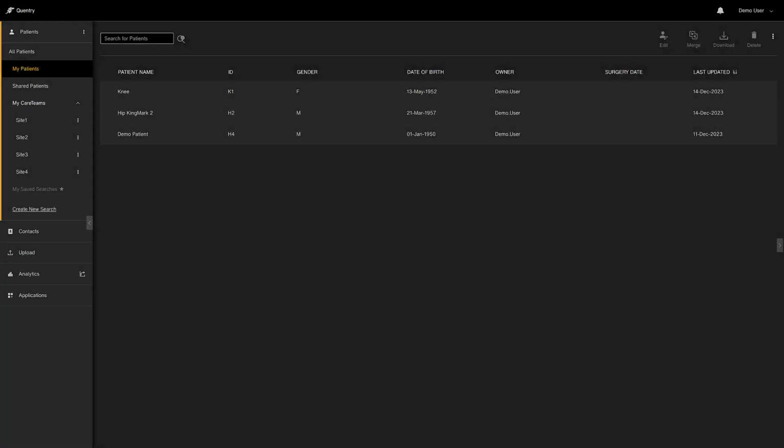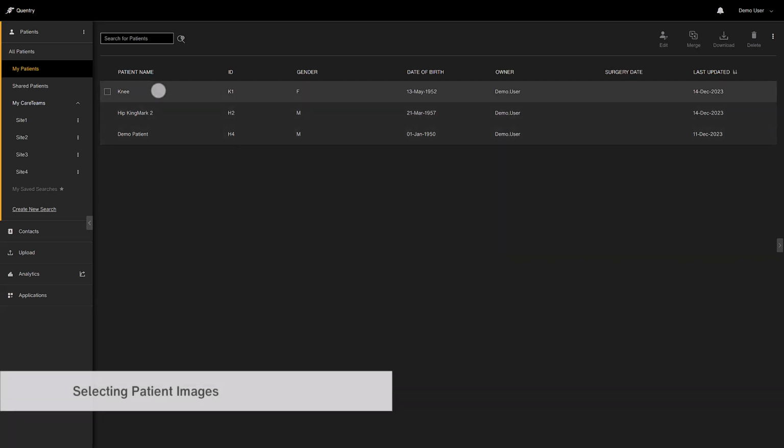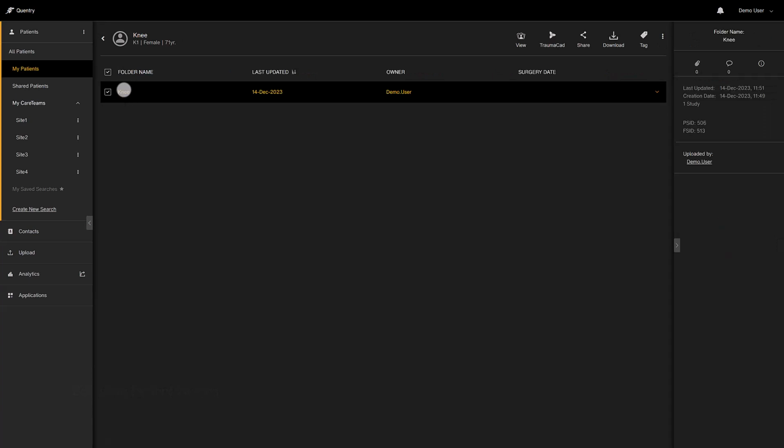This video will walk you through the TraumaCad Neo planning procedure for total knee replacement. Once you log into Quentry, you will see a list of patients. Start by selecting the patient that you wish to plan for. You can then inspect all images that are available for this patient. In this case, the 2 available images have automatically been selected.